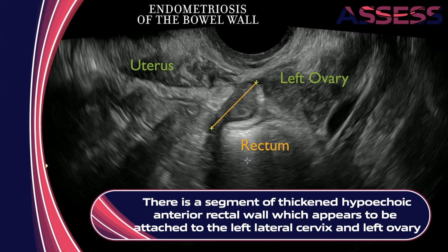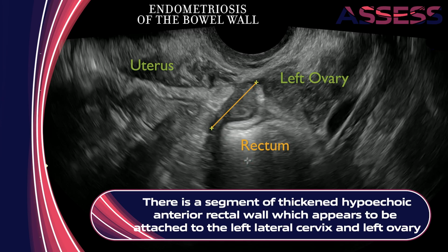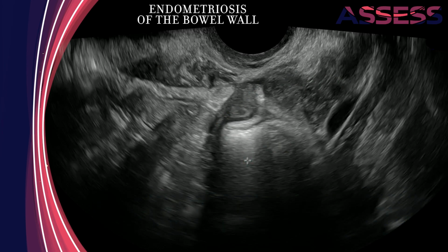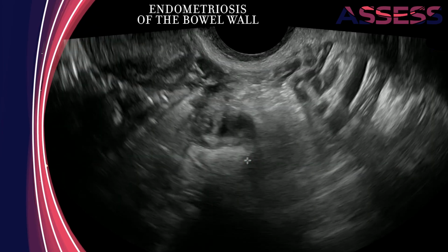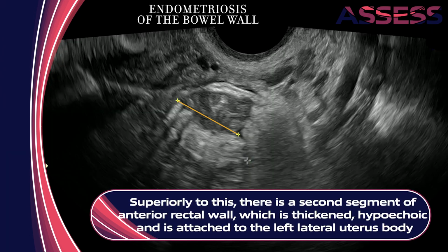Even if you are unsure of the exact segment of bowel you're looking at, it is still helpful to label known structures on the images. The key is to find the lesion and describe the location and appearance so that it can be assessed more thoroughly by an endometriosis expert.